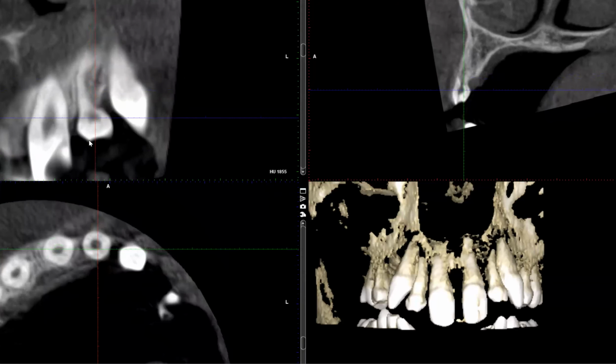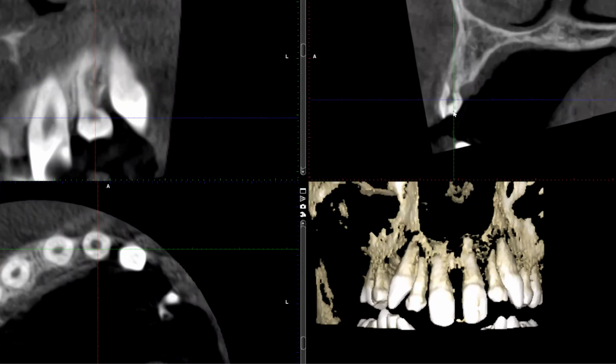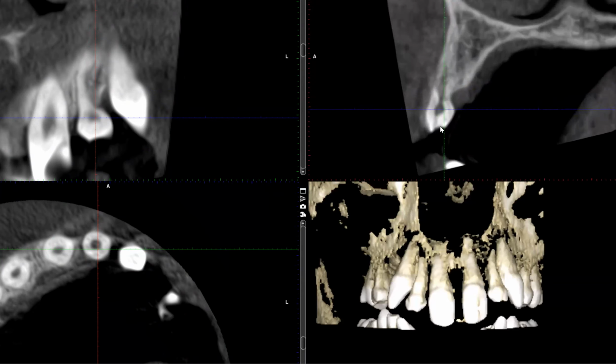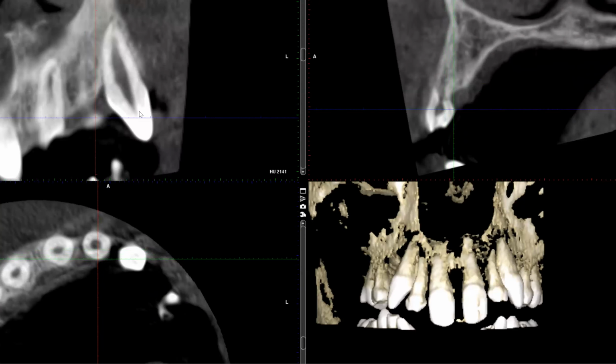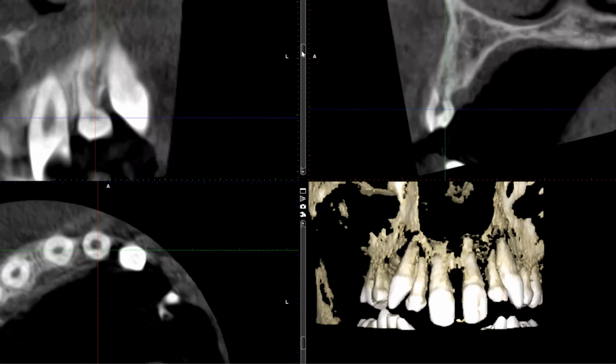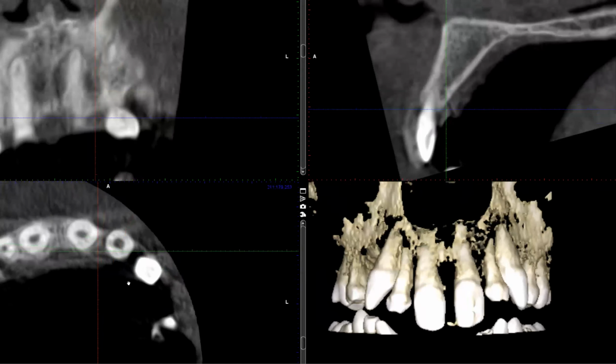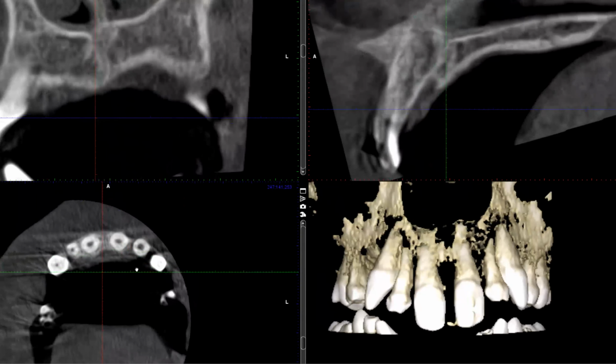And if you look at the shape of the tooth, this is not the shape of a typical lateral incisor. There's a lot of wear on the incisal edge, and even the enamel thickness, while it's difficult to tell, is thinner than the thickness of the enamel from a normal lateral incisor. Just look at the enamel from the permanent canine.